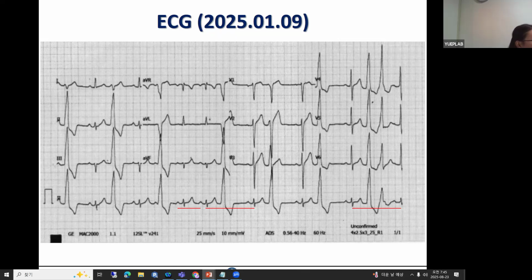So the EKG tells you a lot of things about how you address this issue. I'm sure you're thinking about ablating this thing, so that's why you're presenting to us today. But it's not just ablation. What we need to do is exercise the brain enough to open the possibilities. The discussion of differences is a good thing in EKG. It makes everybody think better and widens the spectrum of view of what you see.